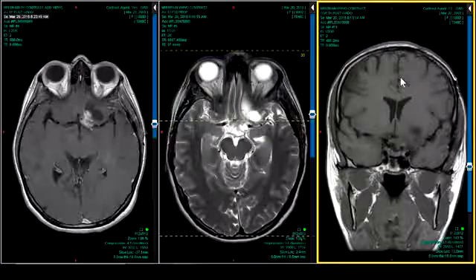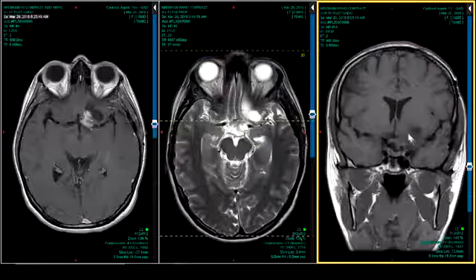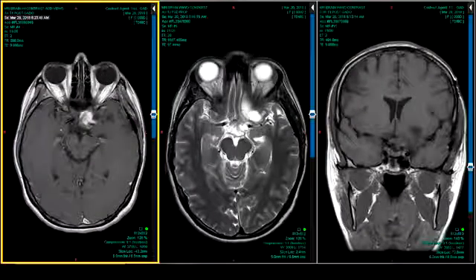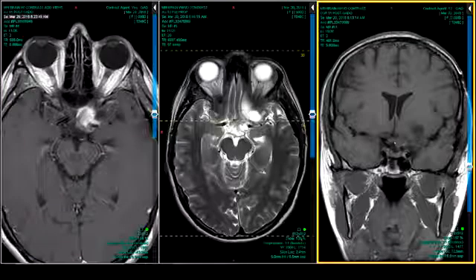Now this one's different, it has a cystic mural nodule, but it may very well be coming from part of that spectrum. And actually the NF1, right, is associated with the ones that are not NF1, that is the optic apparatus pilocytics that are not NF1 are the ones that involve the chiasm.